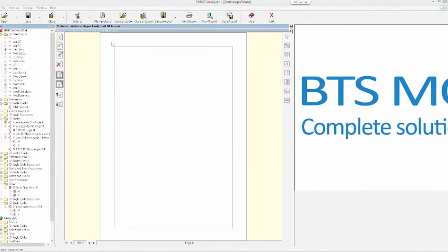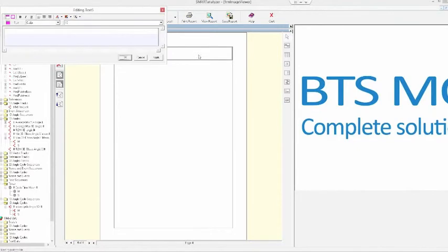Now I want to add the last page, which you can imagine will contain the average information. So imagine the case that we load more than one trial to our protocol, and I want to add here all the average values that we have computed. So again, I want to add a title. Okay, so for example, it will be average 3D kinematics.